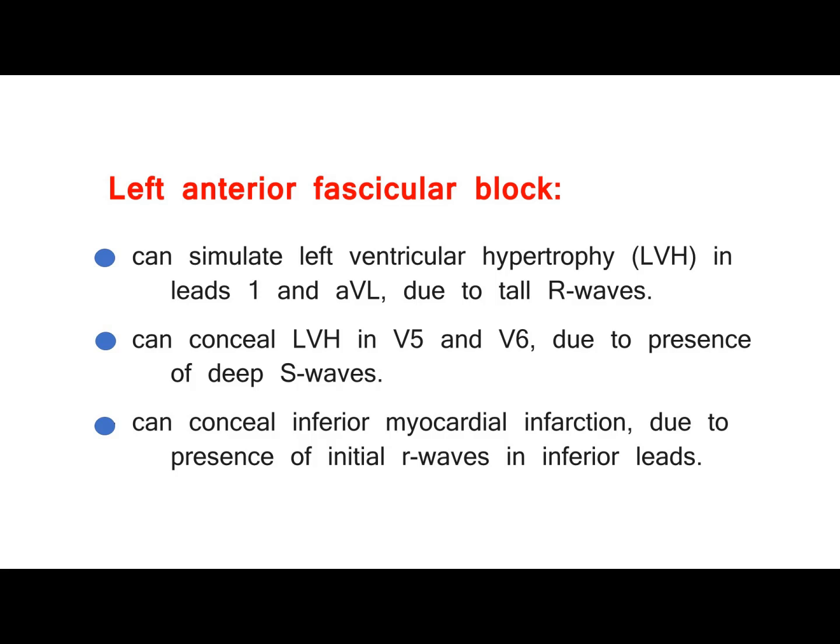Left anterior fascicular block can simulate left ventricular hypertrophy, LVH, in leads 1 and aVL, due to tall R waves. It can conceal LVH in V5 and V6, due to presence of deep S waves. It can conceal inferior myocardial infarction, due to presence of initial R waves in inferior leads.